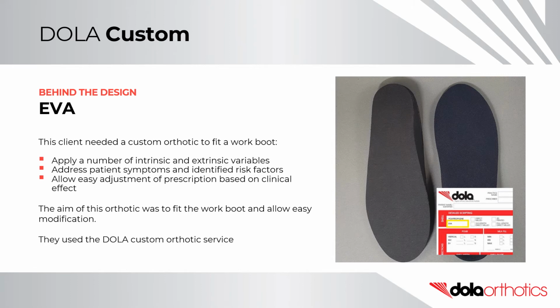Behind the design, EVA. This client needed a custom orthotic to fit a work boot and apply a number of intrinsic and extrinsic variables to address patient symptoms and identified risk factors. They wanted this orthotic to allow easy adjustment of the prescription based on the clinical effect. The aim of this orthotic was to fit the work boot and allow easy modification. They used the DOLA Custom orthotic service.